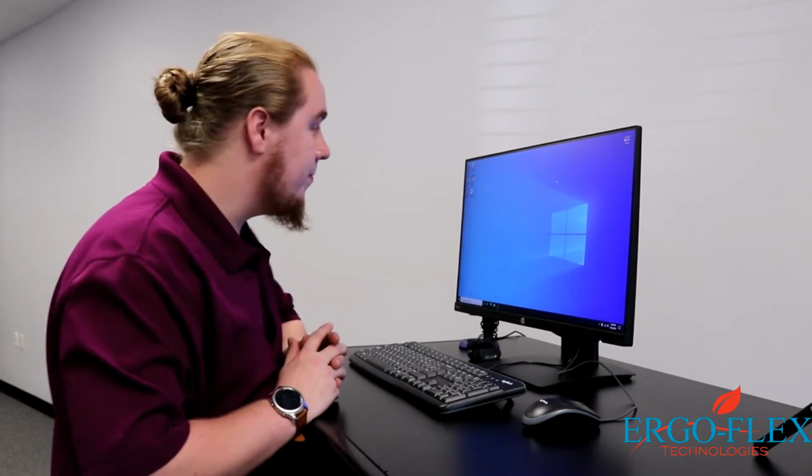Hi, my name is Jonathan Ross with Ergo-Flex Technologies, and today I'm going to be showing you how to install the remote application software. And for you beta testers, this will allow us to install your new version of the Total Brain and Body software. So the process to install the remote application software is actually pretty simple, and I'm going to be walking through how to do so now.